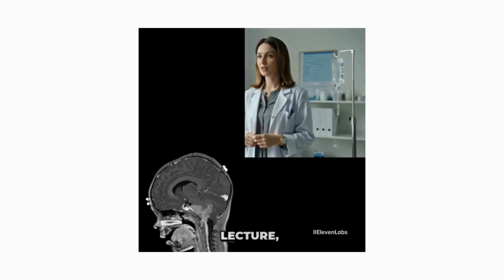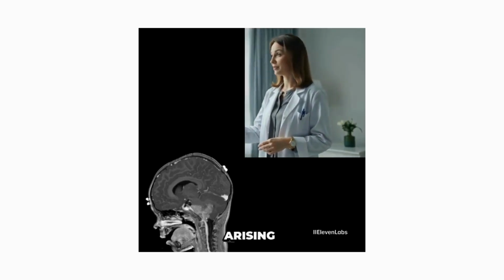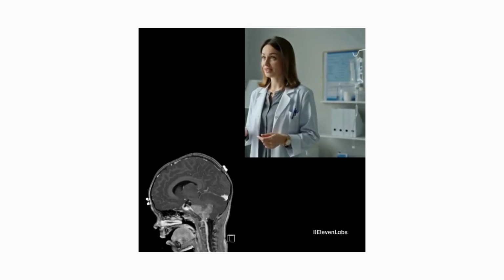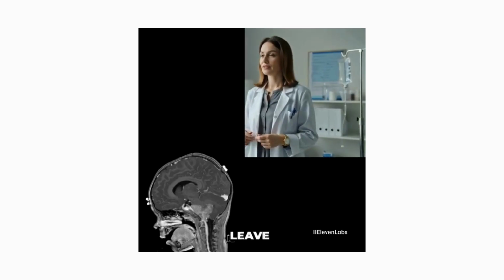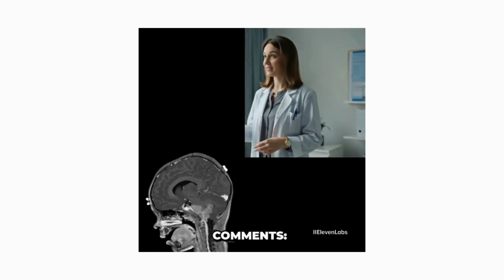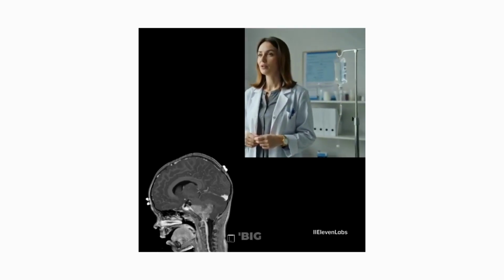Before we dive into the lecture, I want you to look closely at the growth pattern. Is it arising from the roof or the floor? Is it squeezing through the foramina? Pause the video and leave your initial diagnosis in the comments: medulloblastoma or ependymoma. Let's break down the big 2.